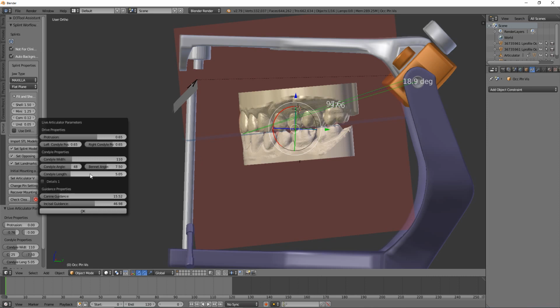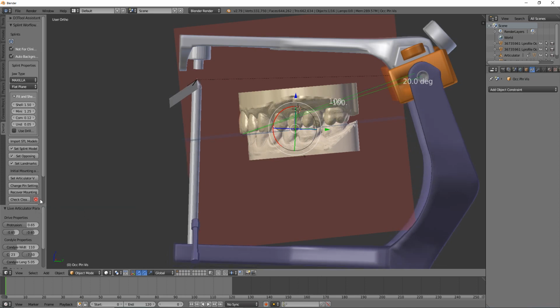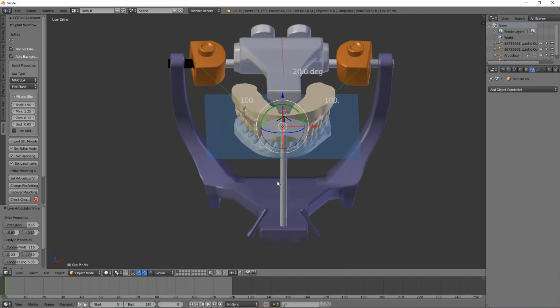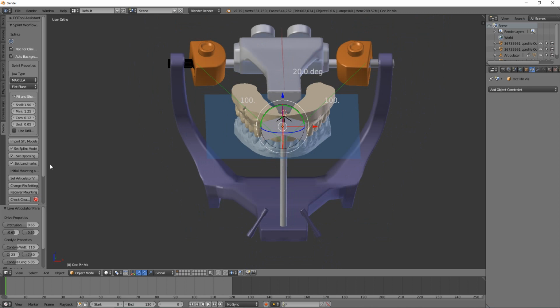So I'm really proud of this. It's been on the to-do list for a while, but it's kind of a major reworking to redo all this math, how we're going to write the keyframes to the animation system, and make sure that you can't get into any trouble in terms of creating a system that's going to cause trouble if not appropriately managed through all the data. So it was a big undertaking. It took me an extra 24 hours than I was expecting, but here we are.